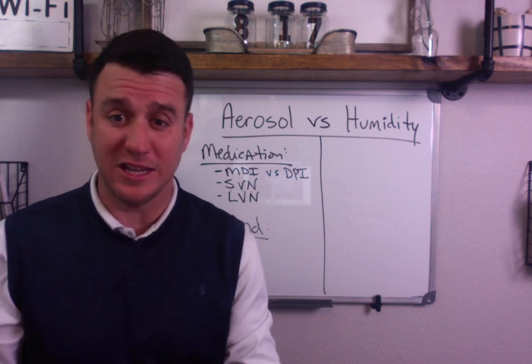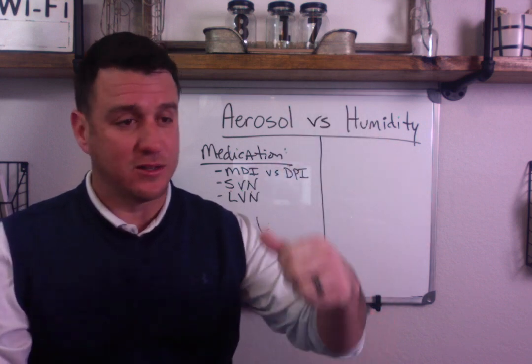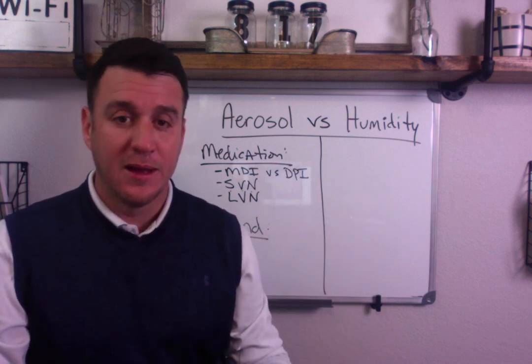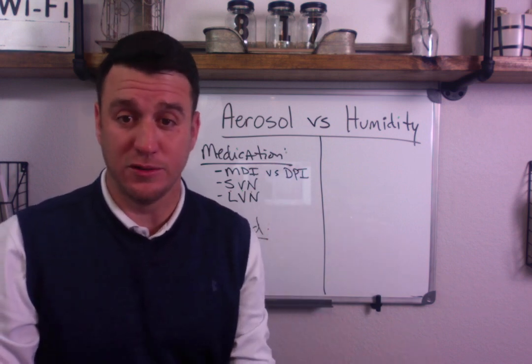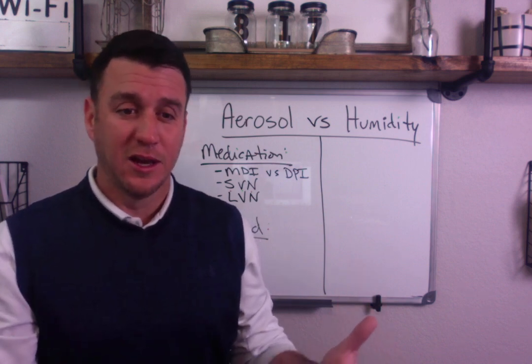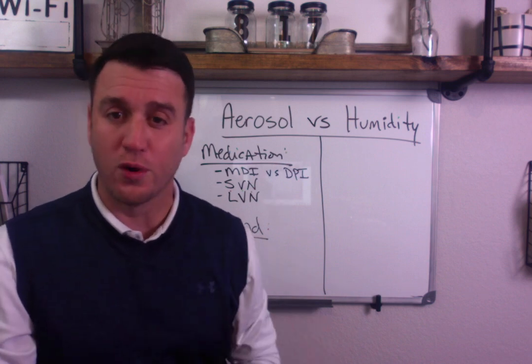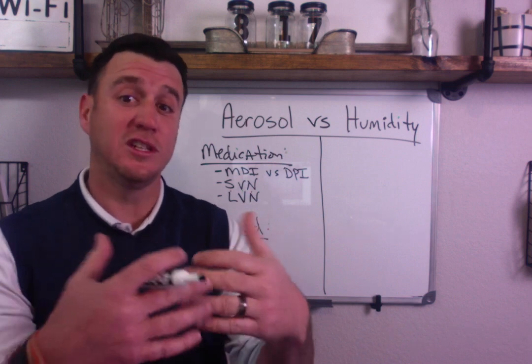It works essentially the same way. A flow of gas goes through the nebulizer, through the medication, and aerosolizes it. There's a baffle that breaks up the particles into smaller particles. The patient inhales, with an occasional deep breath. The difference is we're putting 10 milligrams of albuterol into the large volume nebulizer as opposed to 2.5 milligrams. When we say 10 milligrams of albuterol, we're talking about 4 unit doses. Well, you know that you can't fit 4 unit doses of albuterol into a small volume nebulizer. So you're going to have to use these larger nebulizers.